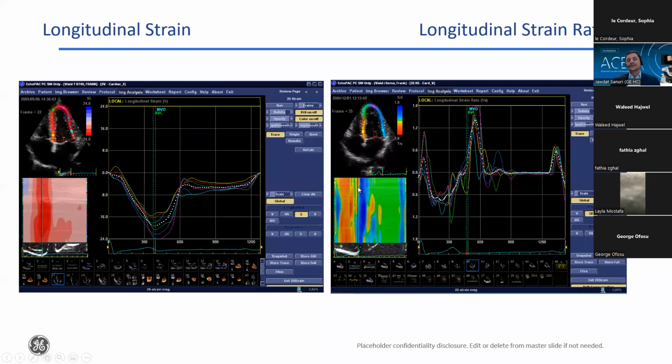There's no more change, and then actually it is positive during diastole, during E prime, and then again positive during atrial contraction. So usually they use this curved anatomical M-mode to detect if there is any post-systolic shortening. If you see any of this red in any segments beyond end systole, beyond aortic valve closure, then that means it's a post-systolic shortening, or if it is an entire region, then it could be asynchrony.